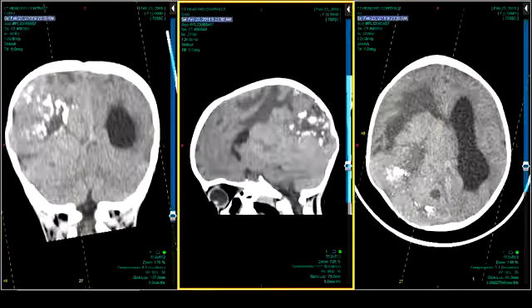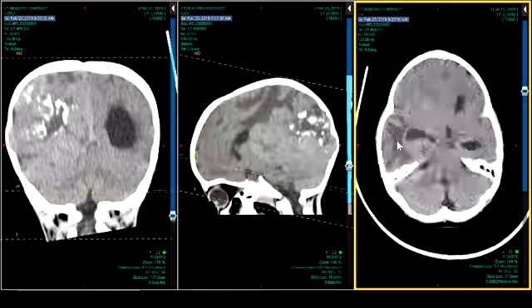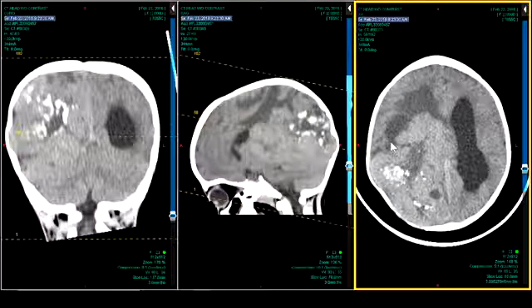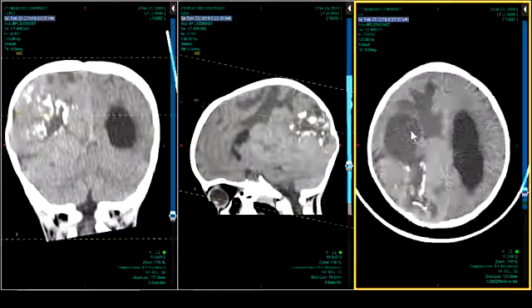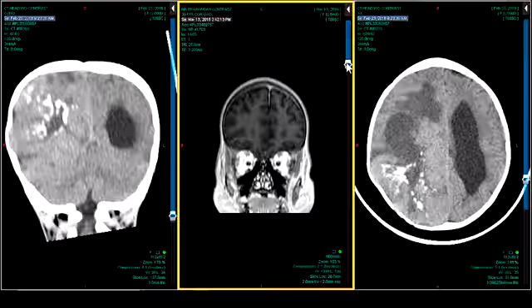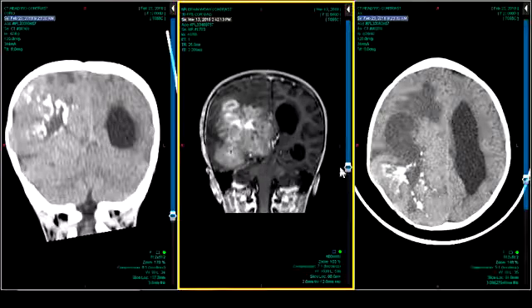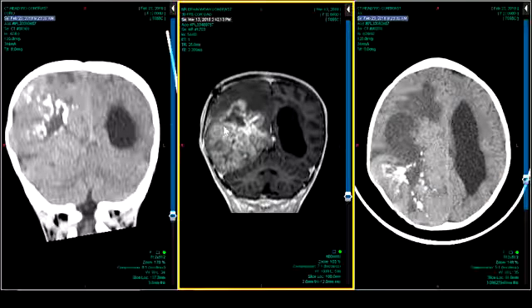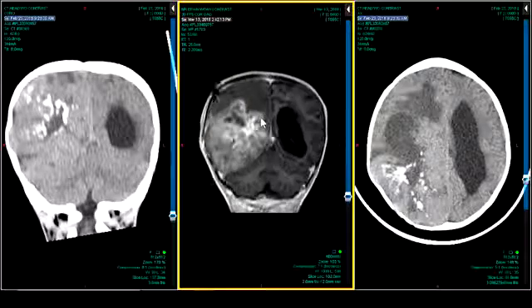Now, I gave some thought to choroid plexus origin, but I don't really think it's diverting the ventricle, but probably doesn't have its origin in the ventricle. This thing is so big, and also I think the enhancement pattern for a choroid plexus carcinoma or something like that, I think we put that in, but I think that's very unlikely. Yeah, choroid plexus malignancies do have this sort of very gyriform, frondiform look to them, which this has a little bit of, but I agree with you that it's epicentered in the parenchyma going into the ventricle rather than in the ventricle going out.